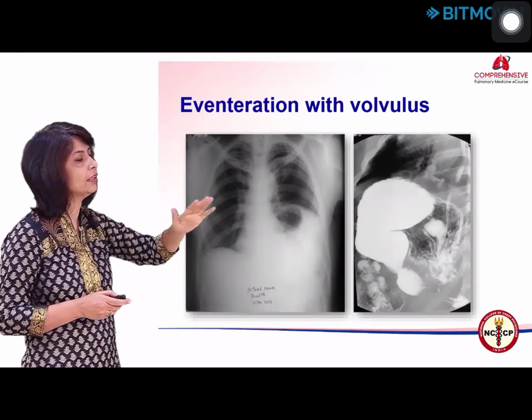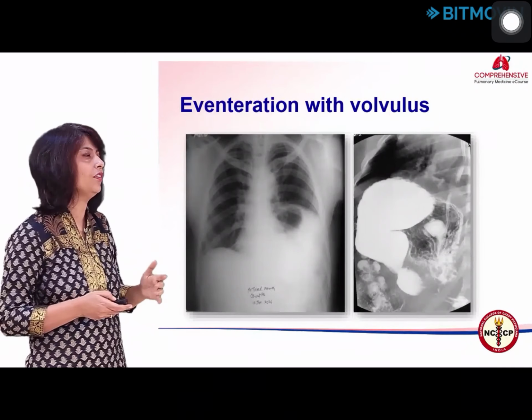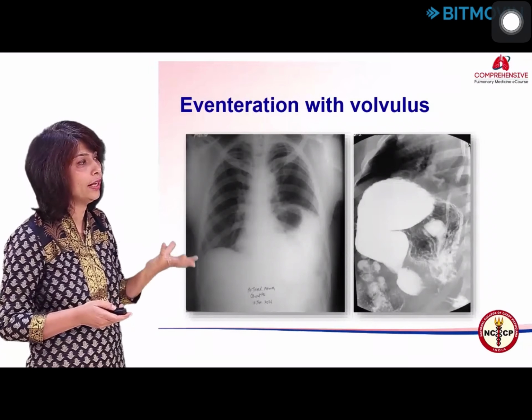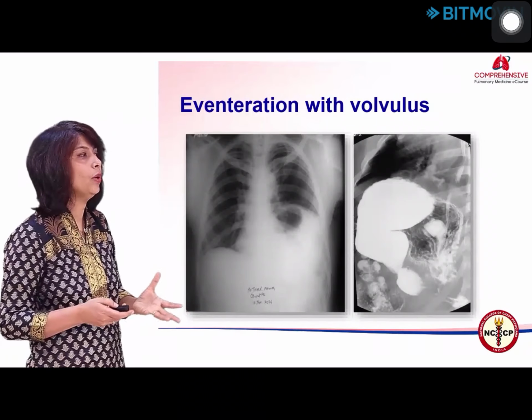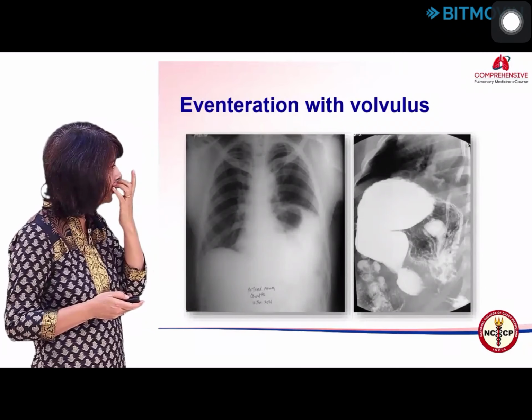Interestingly, ultrasound is supposed to be very good for seeing the diaphragm, but in that patient we really struggled to see it. When you have eventration with the colon and stomach having gone up, or you have a defect, it can get tough on ultrasound, and you would need a CT scan to show this.